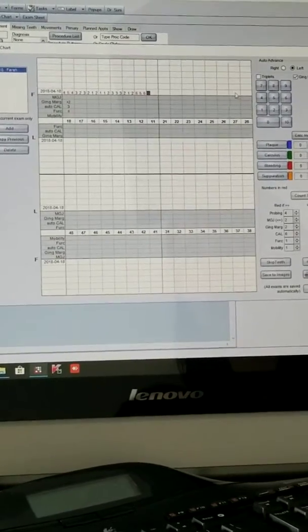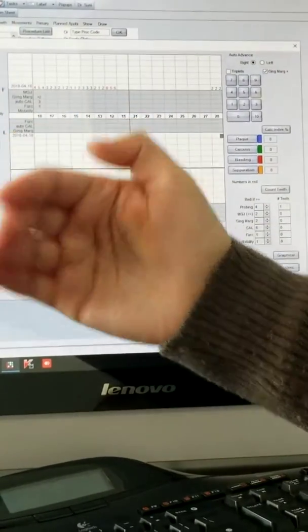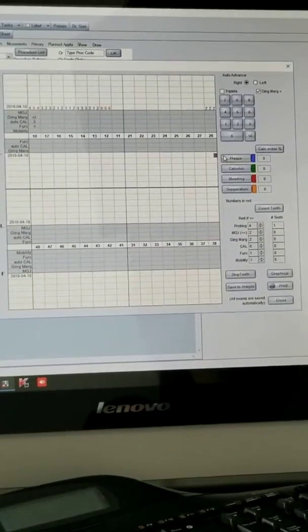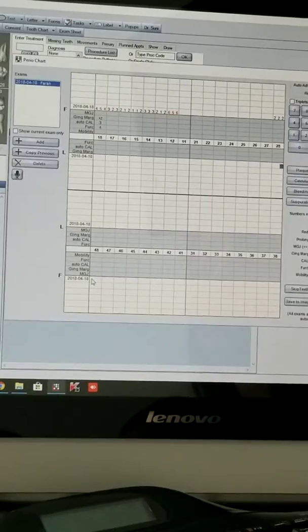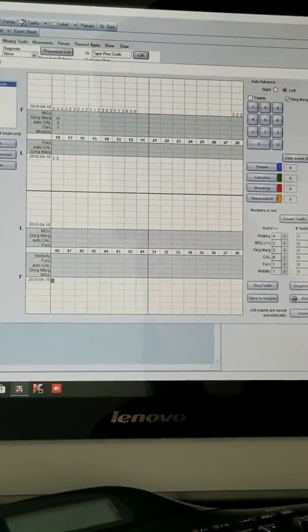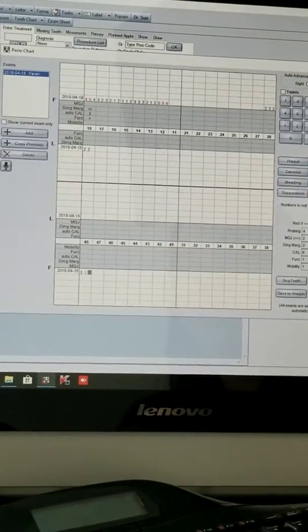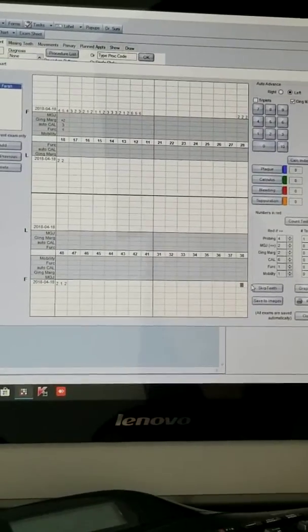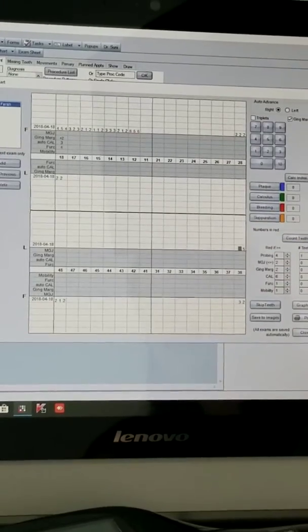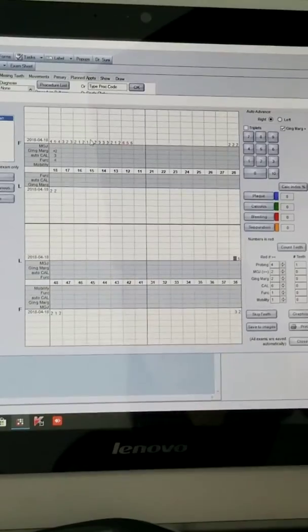And then once you get to here, it'll flip to go back the other way, lingually. How does the bottom go? What I found weird was it wasn't going facial first, it went lingual first, going lingual then facial. So it goes on to facial, moving to the left, and it'll start at 4-8, and then go back up. And you'll have the computer, so it'll know. It'll be a little easier now. It's just hard to change when you have a system already.